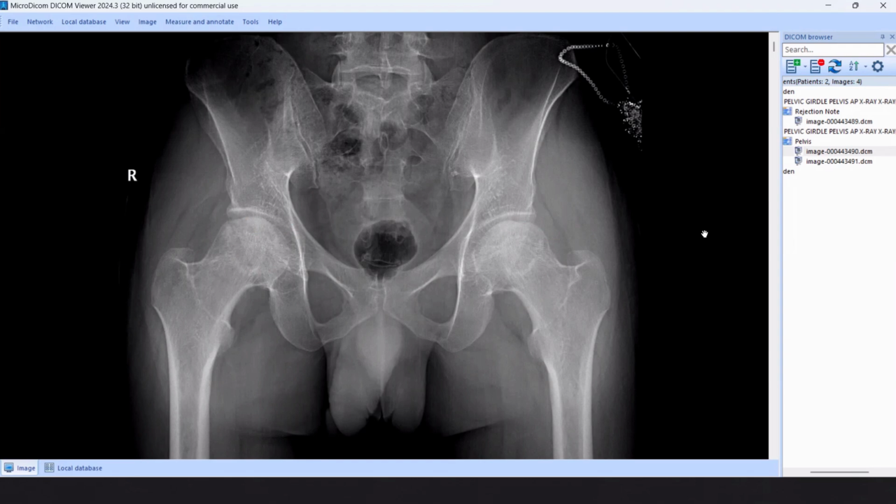Is this one a bony disease or an articular or joint disease? Is this abnormality considered bony? Bony, because the acetabular articular surface is very smooth, and we don't have any changes on the opposite side. So we are dealing with a pure osseous lesion, bilateral femoral head avascular necrosis.